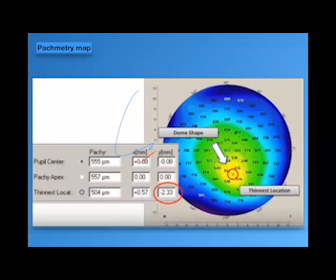Now we have to study 3 points in the pachymetry map: the thickness at the apex of the cornea and the thickness at the thinnest location. About the first one, the thickness value itself, and the relation between the apex of the cornea and the thinnest location, and the location of the thinnest location from the apex of the cornea, the deviation of the thinnest location.